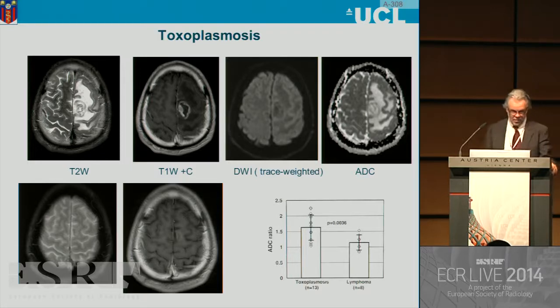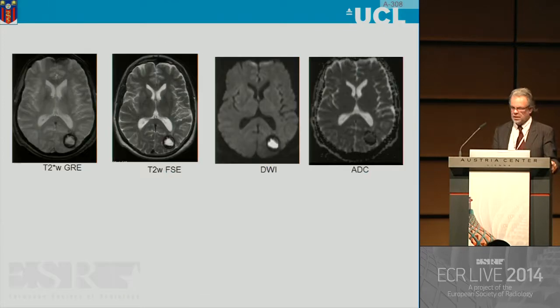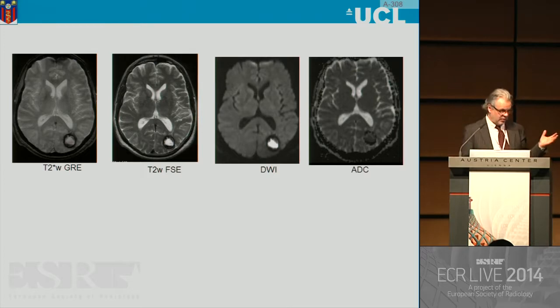So if you have the appropriate clinical context, you have to think of toxoplasmosis if it looks like a free diffusion in the center. And TB can behave both ways, as I showed you. Hematoma, very important. This was a clinical case. The house officer came down. The patient's been on antibiotic now, has the abscess resolved? And I said, this is not an abscess.